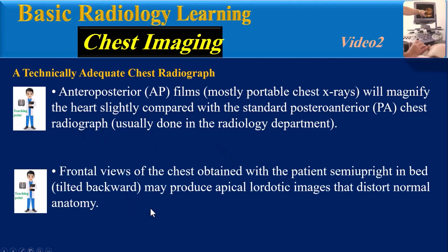Frontal views of the chest obtained with the patient semi-upright in bed or tilted backward may produce apical lordotic images that distort normal anatomy.